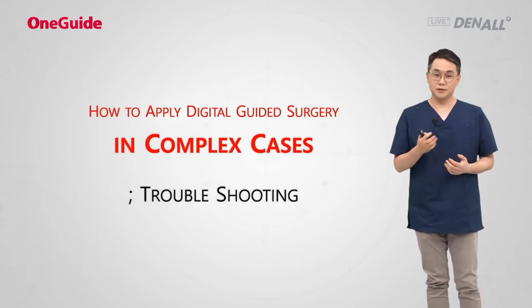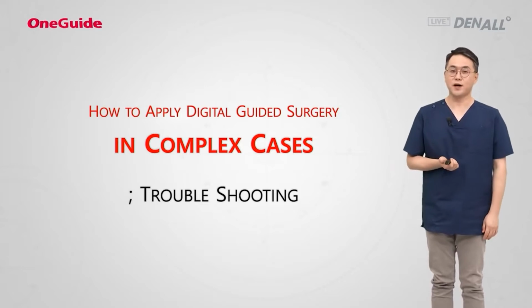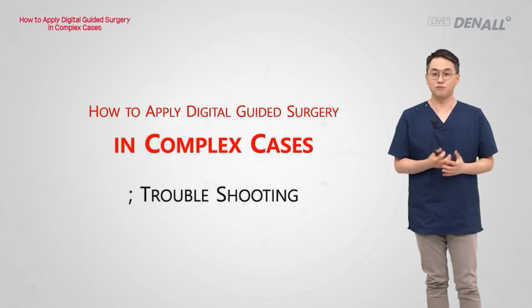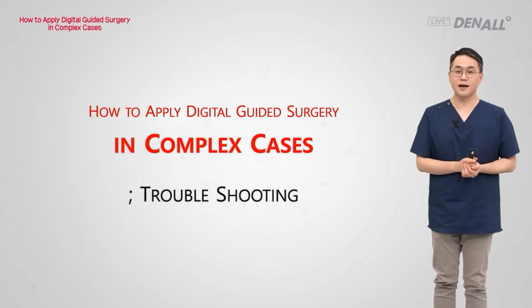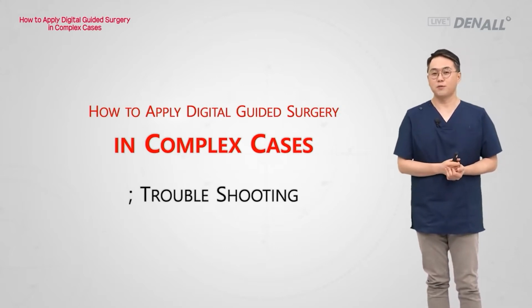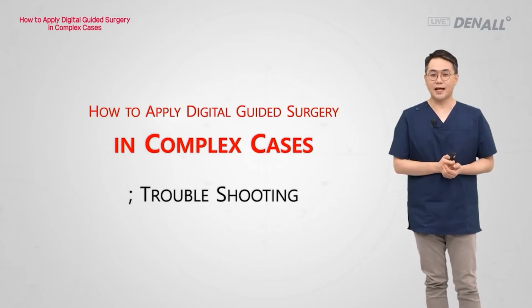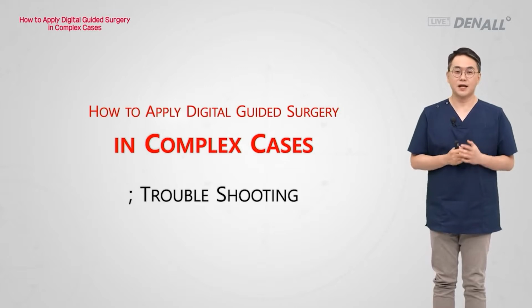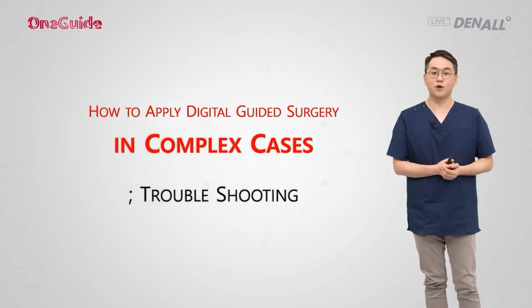I will talk about how to apply digital guided surgery in complex cases, such as complete edentulous or multi-teeth missing cases, full mouth implant cases. Sometimes the placement cannot go as planned, and in the upper anterior, implant tilting can occur. How can we do the troubleshooting for such cases? So this is what we are going to talk about in this last lecture.